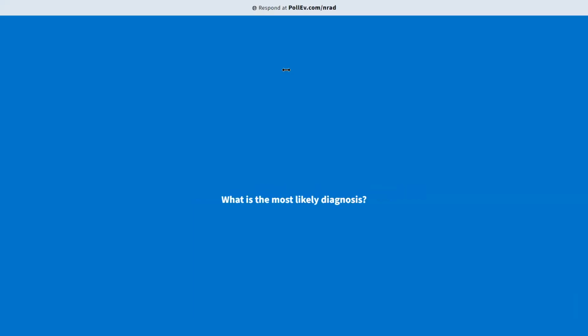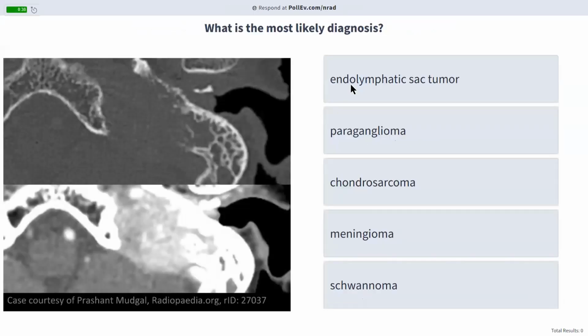A good question. Yeah. All right, next question. What is the most likely diagnosis? The presentation doesn't really matter in this case, but let's say they presented with Horner syndrome.